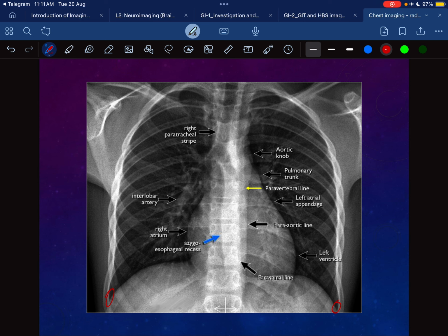Do I see the lung apices? Yes, I do. However, the first rib I didn't see, so it's kind of an incomplete assessment. I barely see the scapula, so it's also kind of an incomplete assessment. It's better to have a full evaluation of the scapula when you see it. Although this is a chest X-ray, I would make it a little bit higher up.